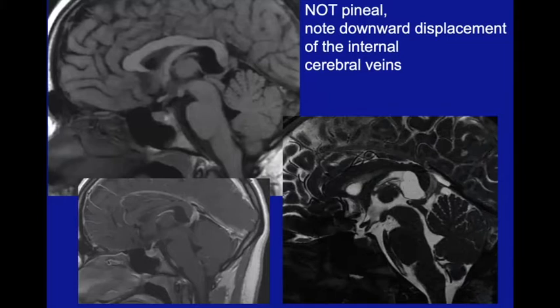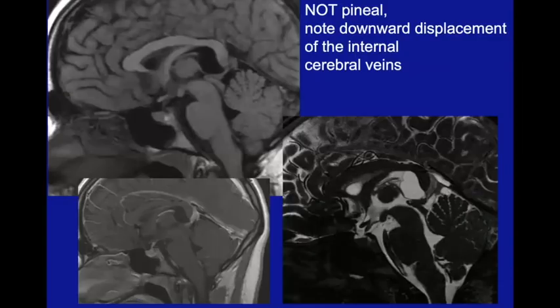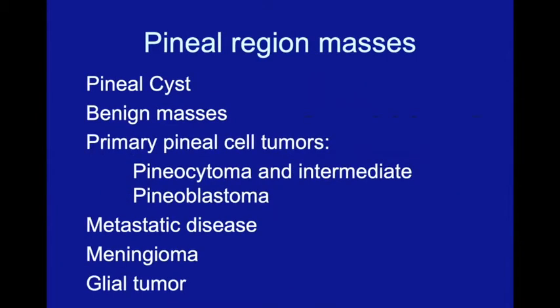This is separate in terms of the differential, because this lesion lies above the internal cerebral veins, placing it, and if the fornix is elevated up, that puts this into the region of the velum interpositum. So again, learn this fine anatomy, and this will help you decide in terms of the nature of the lesion exactly where the anatomic structure is that you're pursuing.